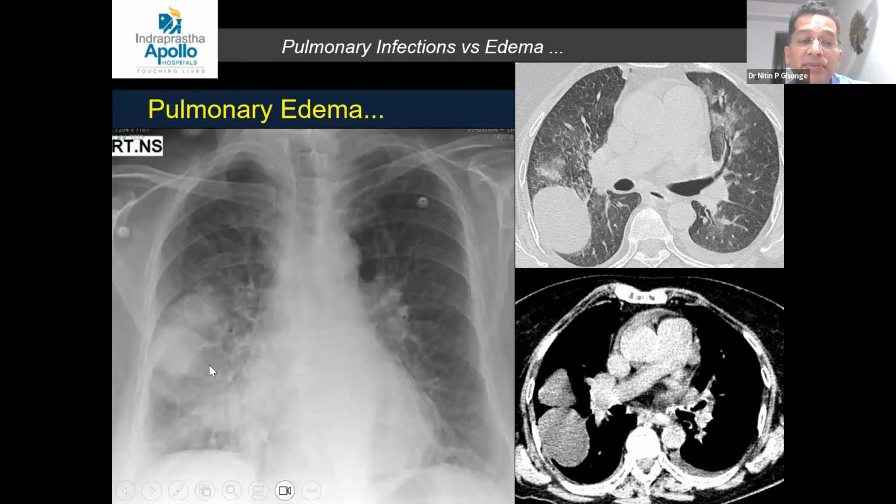You can see bat wing appearance, you can see pseudo tumors like this, entrapped fluid in the pleura. These are the entrapped fluid. This is typically pseudo tumors, so no need to further evaluate. These are typical loculated fluid in the fissure, minor fissure, the major fissure. These are called pseudo tumors because of the fissural effusion.